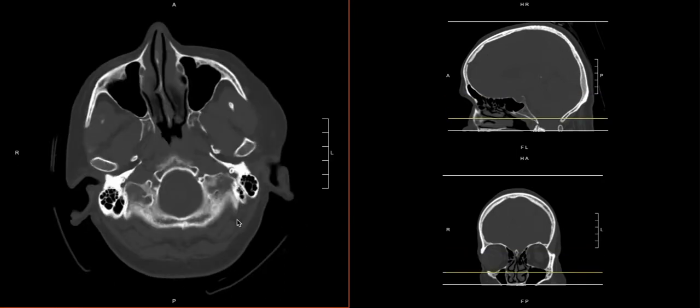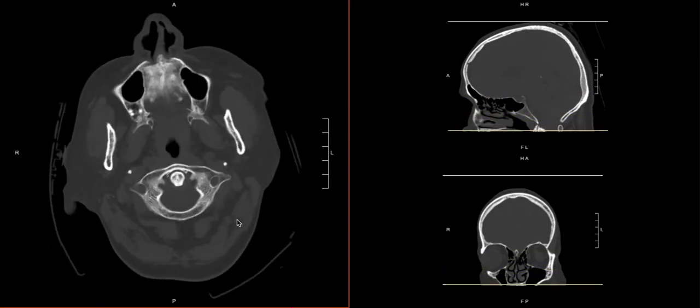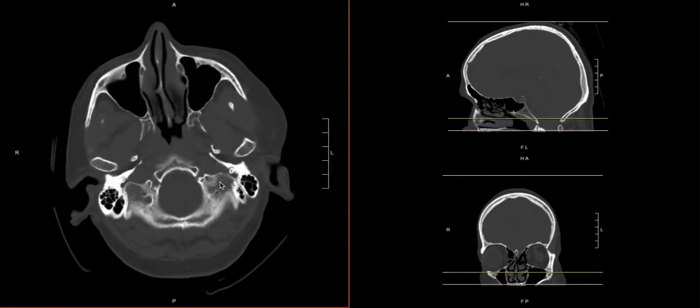Looking for fractures, we come down the occipital bone, and we'll find ourselves at the atlas axis junction. This is what I characterize as a central portion. After we look at the posterior bones, we can look at the foramina transversaria. This is where the vertebral arteries will be. Depending on how low you go, you'll catch more or less of the cervical spine. I think it's important to make sure there are no fractures that violate this space. That can be an indication to get a CTA of the head and neck.